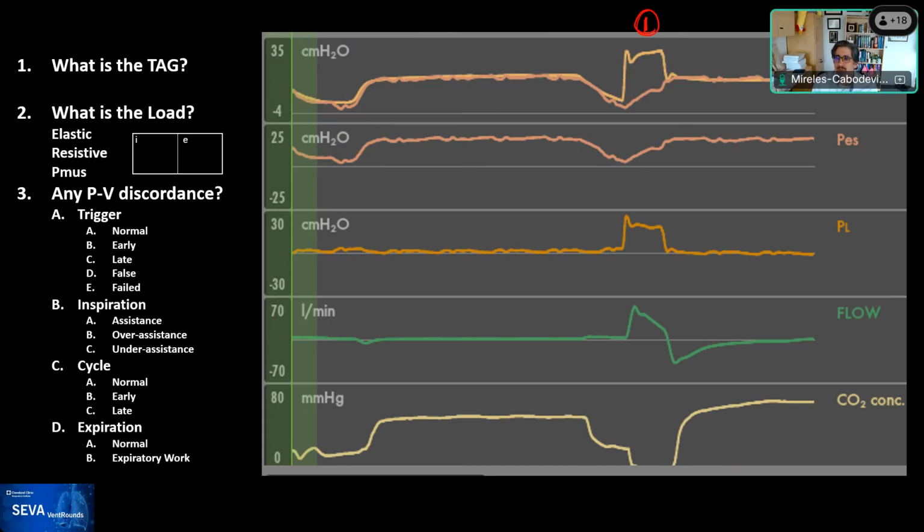And remember, have no fear, learning environment, release the beast. All right. A good amount of people saw this as pressure. So great job. In all general terms, this is definitely pressure control. So you're correct. Anybody want to share why you thought this was pressure? What gave it up for you?